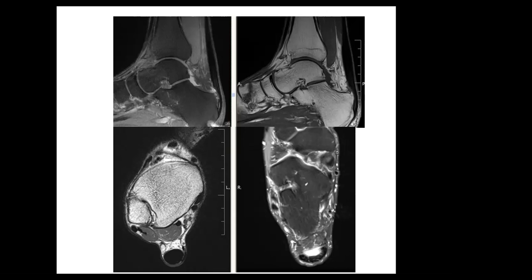There's one more finding as well in this patient. There is edema in the fat pad in the posterior compartment of the ankle joint. I think Kager fat pad. Well, Kager's fat pad is this one. Which anatomic structure is this one? Retrocalcaneal bursa. Yes. So there's retrocalcaneal bursitis, and maybe this is the reason why the patient presented with retrocalcaneal pain.